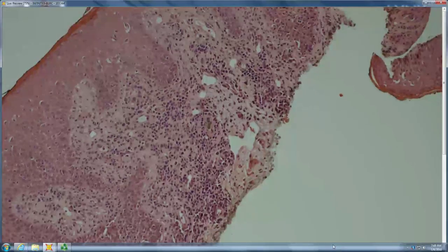What other things recruit plasma cells? Rhinoscleroma does, and it's more diffuse, with Russell bodies. Rhinoscleroma tends to occur on the rhino, on the nose. And there are places where you tend to recruit plasma cells anyway, right?